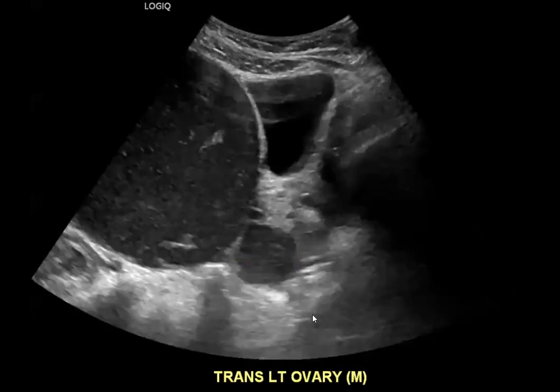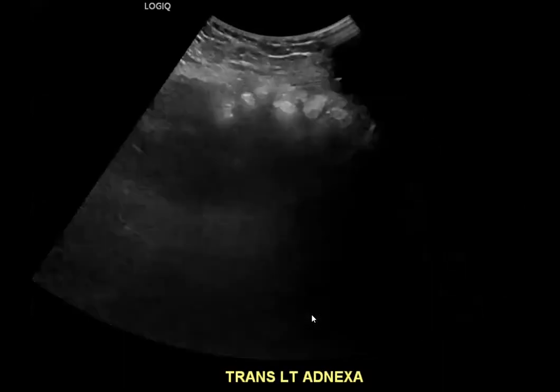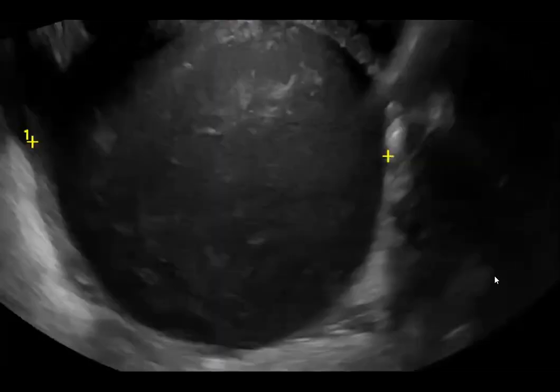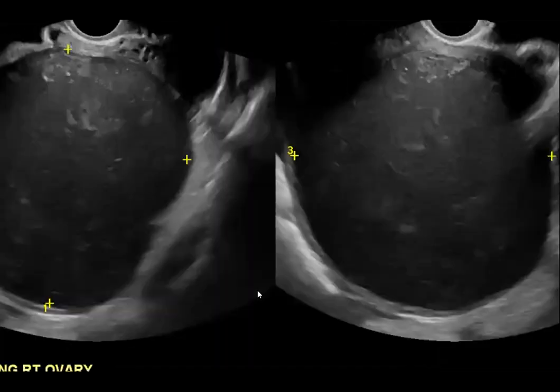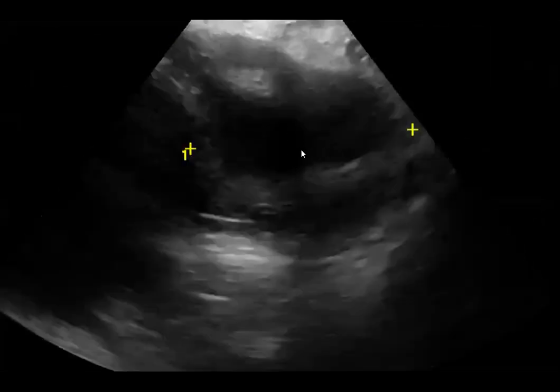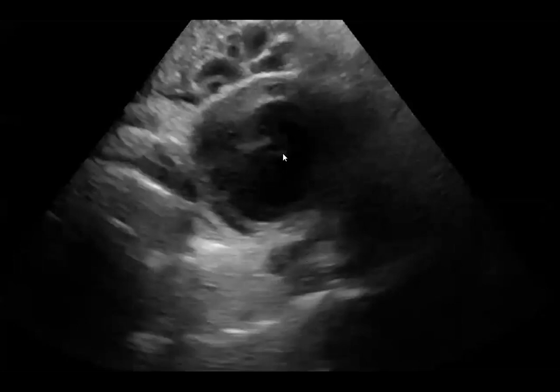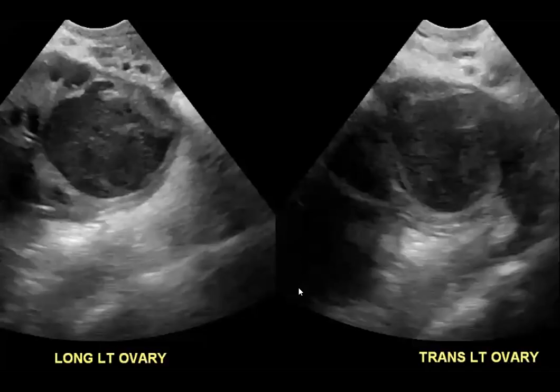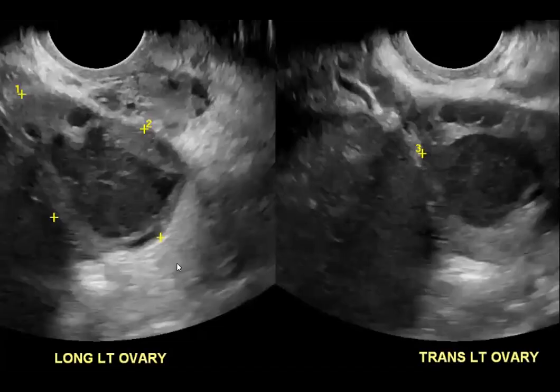And then on the left side, sorry, I'm going to go fast. Okay, so we still have our big lesion on the right side. And then we also have some lesions on the left side too, that we're seeing in the left ovary here. So residents, what would you do at this point? You see bilateral lesions that look like this.